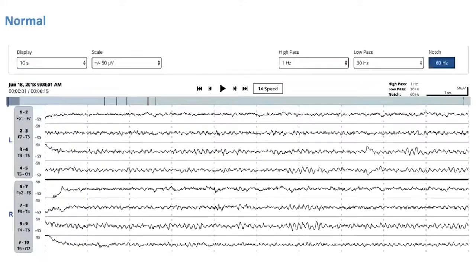Great. How's that different from normal, Dr. Stern? So one pithy response is there are many ways of being normal. There are only a few ways of being abnormal, at least in EEG, maybe for everything. And so very often, if you're not seeing a clear abnormality, you might want to just call it normal. But what you show in front of here is a boringly normal EEG. Not that normal is so boring, but I'm seeing frequencies and symmetry that I know are normal, and I'm seeing some variation in that across the page. And what I'm not seeing is the epileptiform abnormality.